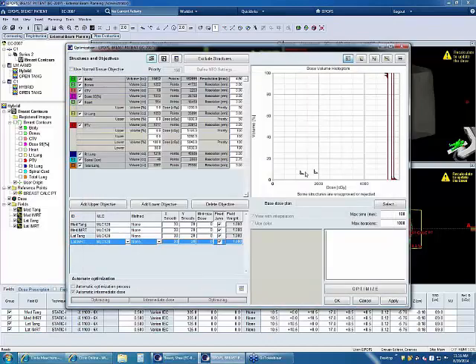Okay. I have 2 uppers, 2 lowers, and on version 11, which is what I'm showing you this on, it's kind of nice to have 2 uppers and 2 lowers in IMRT and with RapidArc. My heart, I'm saying 5% can get 1,200. My left lung, 6% can get 1,800, and I shouldn't have any problem with that. All the rest of the structures, such as right lung and spinal cord and total lung, those are basically out of the field. I mean, right lung and spinal cord is. So I don't have to use the dose 95 because I made my own PTV from that.